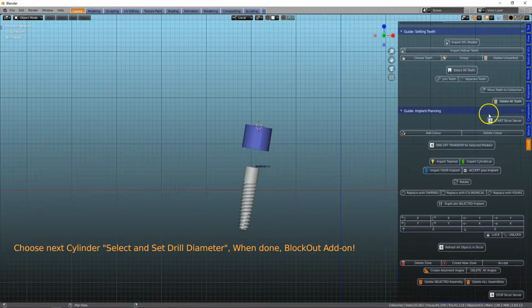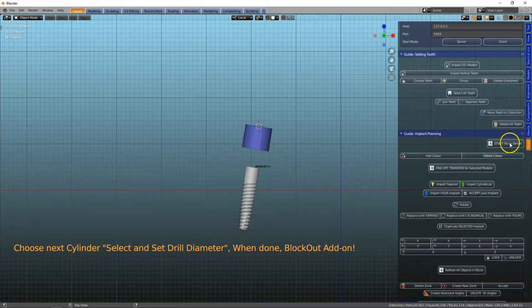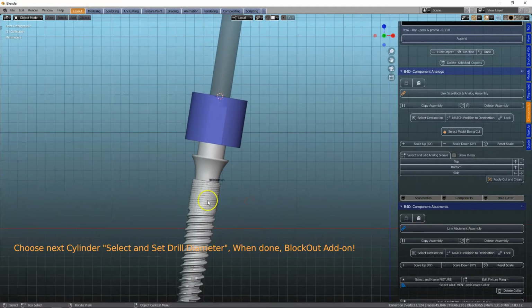So if you wanted to unhide them, go into the outliner, or you can just search for the field in the components module where we've got these here, and you can then continue as before.